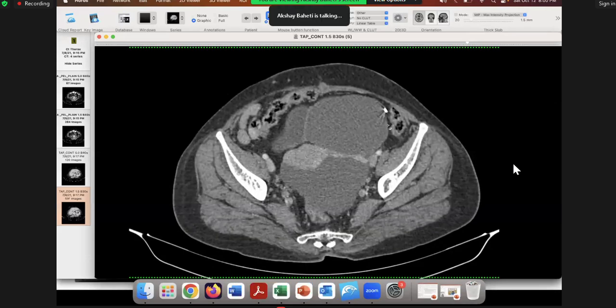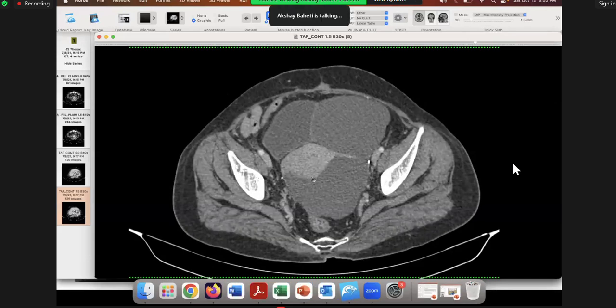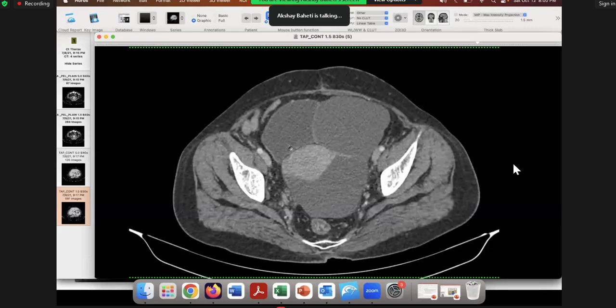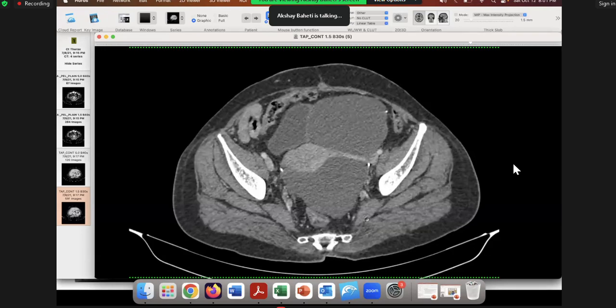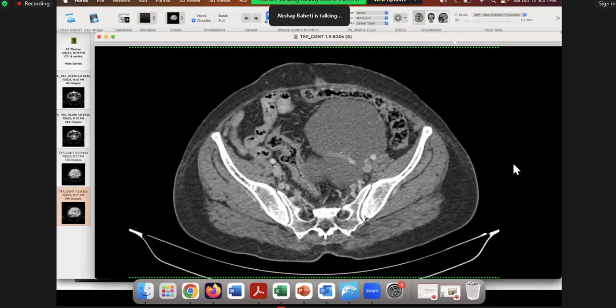So, basically it will follow the contour of the pelvic cavity. So a mass will be round or oval or whatever. But this you can see right from here, it is following the contour of the pelvic cavity all the way, right? And that a mass will never do, right? A mass will never follow the contour of the pelvic cavity. It will push things around it, not follow the contour. And then what is the classic thing? Why does a peritoneal inclusion cyst happen?